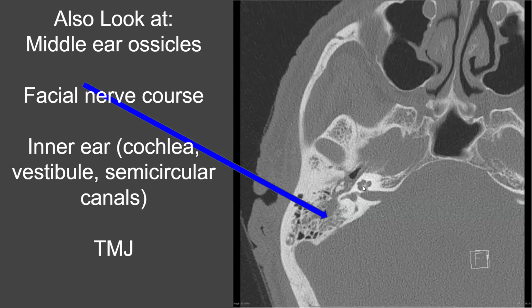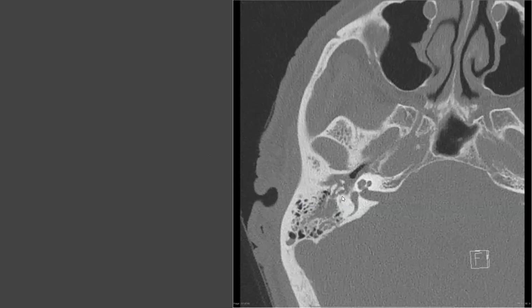We know the vestibular cochlear nerve is coming up here. One's going to the cochlea, one's to the vestibule. Here's the vestibule. Here's the semicircular canal. And here are the middle ear ossicles, and importantly, right here, these middle ear ossicles have fluid around them.